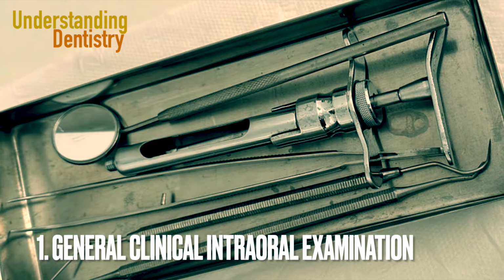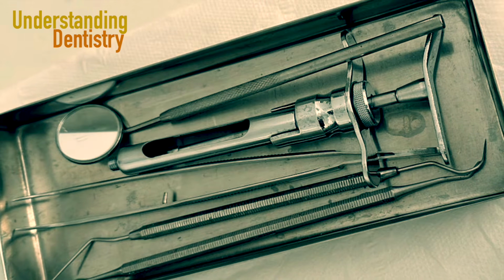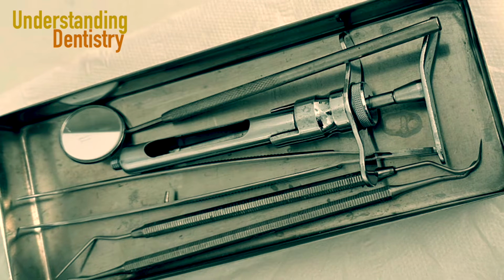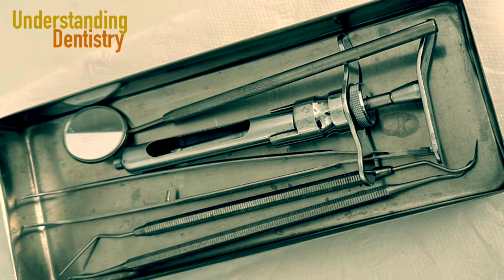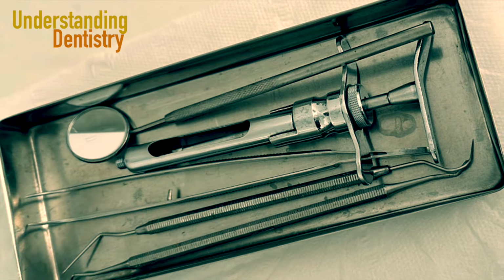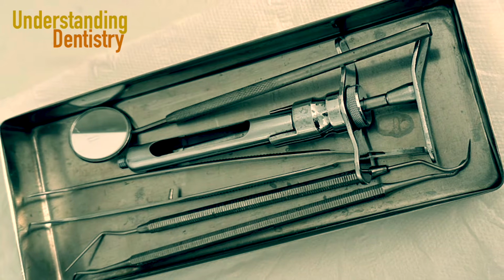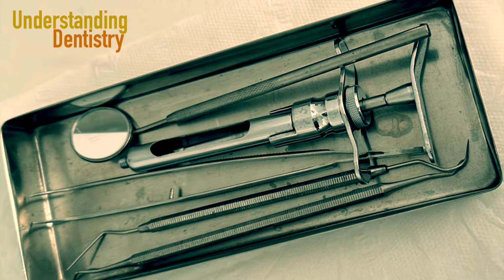will vary from country to country, from institution to institution, the way we make the dental clinical kits, okay? But from top to bottom, we have the mirror, of course, then the dental syringe, then the tweezers, the explorer, and finally we have the excavator, okay? The excavator in Latin languages is called cureta as well, so this can be a little bit tricky, but in English we call it excavator.